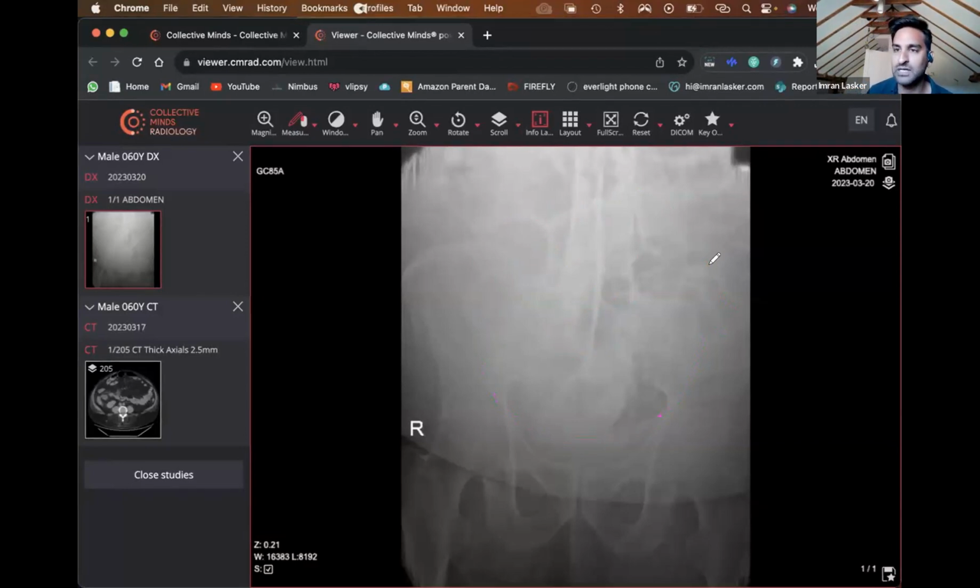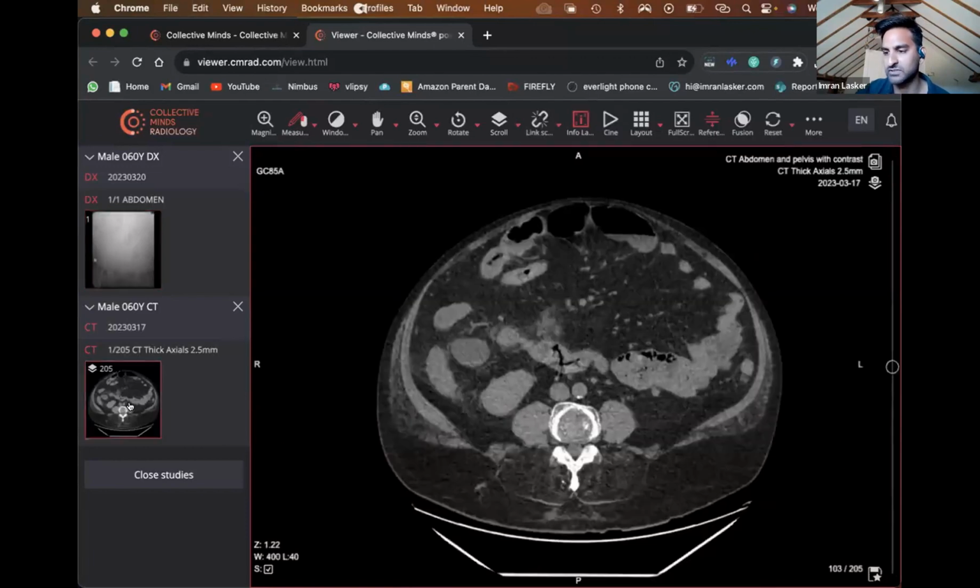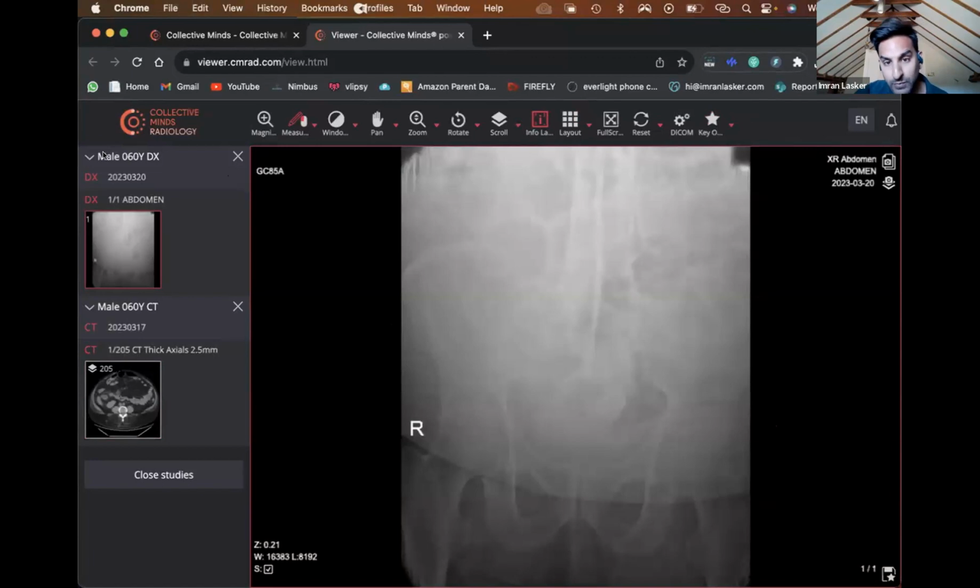And actually, when I do my reporting of abdominal X-rays, I do say no evidence of air-filled bowel obstruction, because if it's fluid-filled, sometimes you can tell. Sometimes if it's really fluid-filled, you can't 100% see the bowel. And I've seen normal-looking abdominal films go on to have what clearly is significant small or large bowel obstruction because it's so fluid-filled. Okay, so we've got a few people saying pneumoperitoneum.